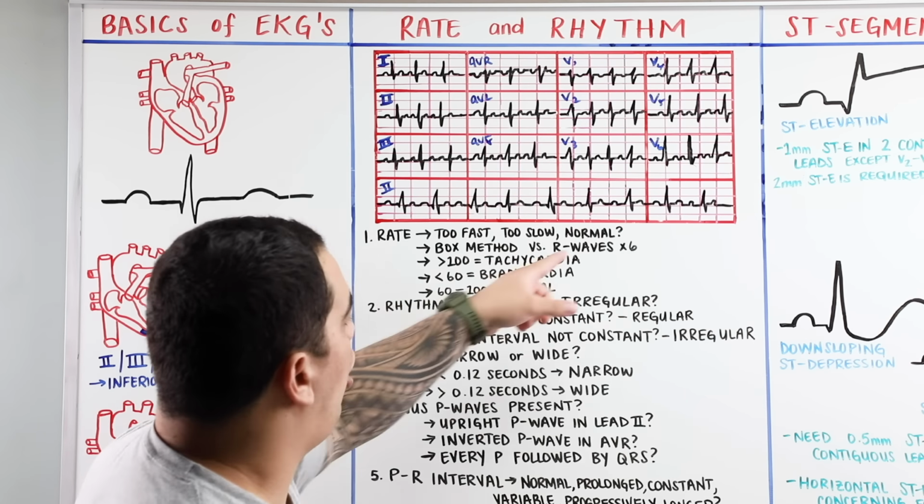So this is really what I want you guys to remember: approach every EKG the same way in determining the rate and rhythm for a 12-lead EKG.